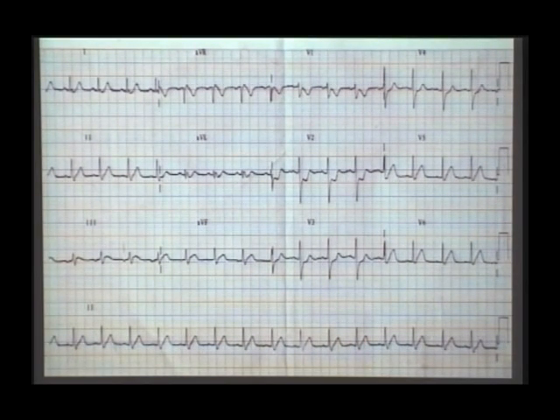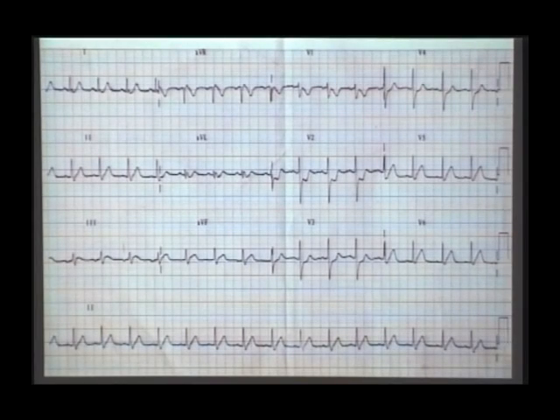So that's what I told you, whether it is acute or chronic inferior wall infarction, first look at the chest leads. In inferior wall infarction, everybody looks at the inferior leads. You must look at the chest leads. In a chronic inferior wall infarction, V1 showing a tall R wave tells you that's a chronic posterior wall infarction. Whereas in an acute inferior wall infarction, V1, V2 showing ST segment depression tells you it's a reciprocal change of a posterior ST segment elevation. So I have additional posterior wall involvement if you see this sign. So this is an infralateral posterior MI, early hyperacute phase.